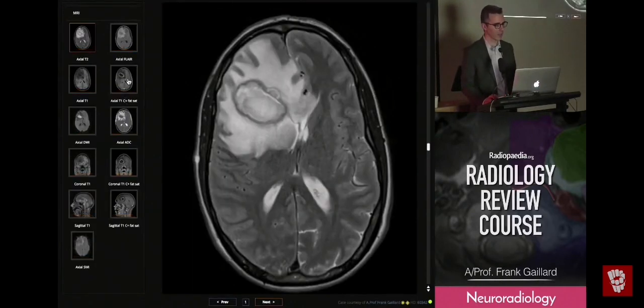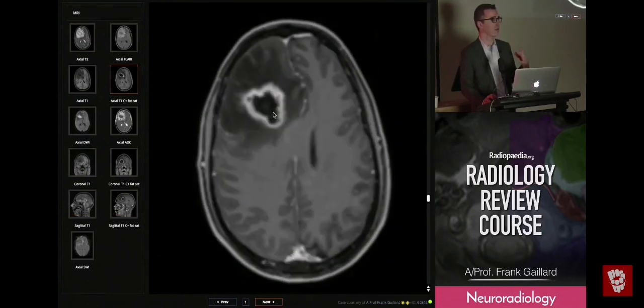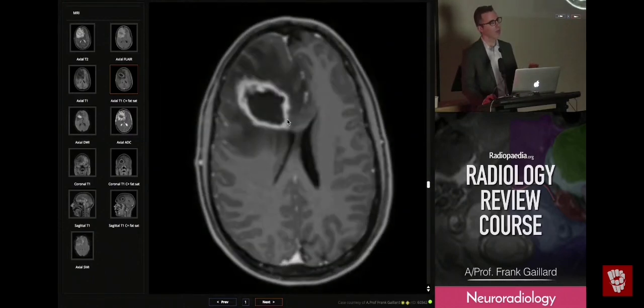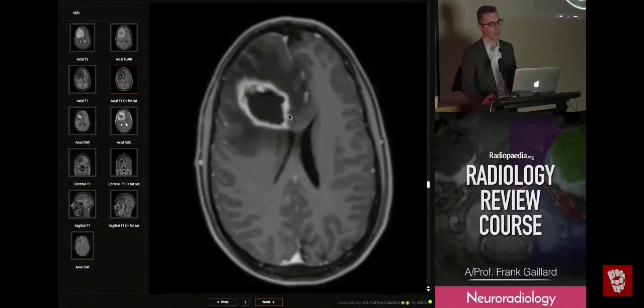So let's have a look at an abscess. So we have a complete sphere of enhancement that when you look at cross-sectionally will appear to be a ring. And on the middle slices, where you're not getting much partial voluming, it's really quite regular. It'll usually be a bit thicker towards the cortex, where there's more blood supply, a little bit thinner towards the ventricle, and eventually it'll point to the ventricle and discharge into the ventricle, and you get rip-roaring ventriculitis, and the patient will die, usually very quickly. So you preferably make the diagnosis and treat it before that happens.